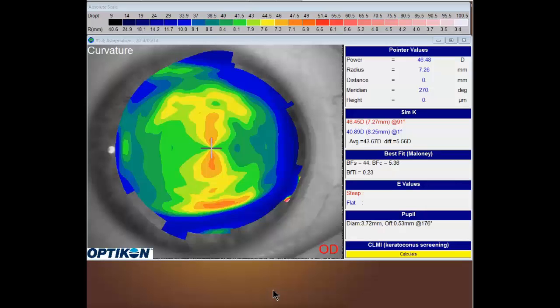So when looking at your topography, think about how to use the software to create a lens that will mirror or match the corneal surface. If we think back for a moment of how we were taught to fit traditional gas permeable lenses, we were told to fit a spherical, single curved lens to flatten out and compress that corneal surface. And if there was astigmatism, then we'd try to use 2 curves on the back of that lens to try to refit that eye. We'll think more in different dimensions with Wave software.